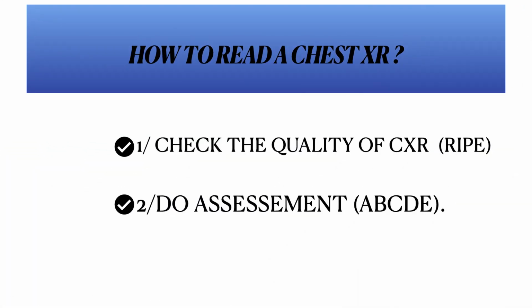How to read a chest x-ray? So initially to read chest x-ray we need to follow these steps. Firstly by checking the quality of chest x-ray, then by doing an assessment.